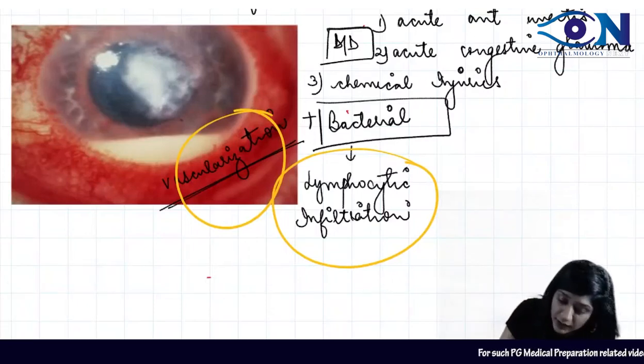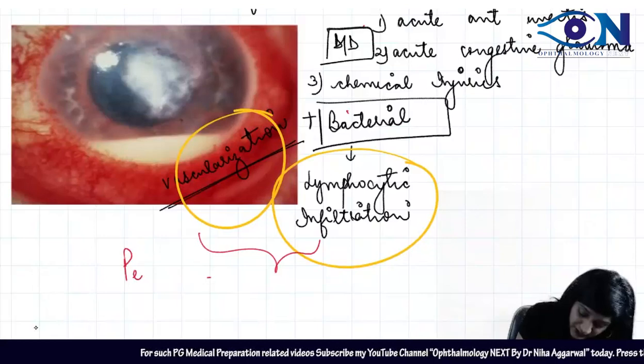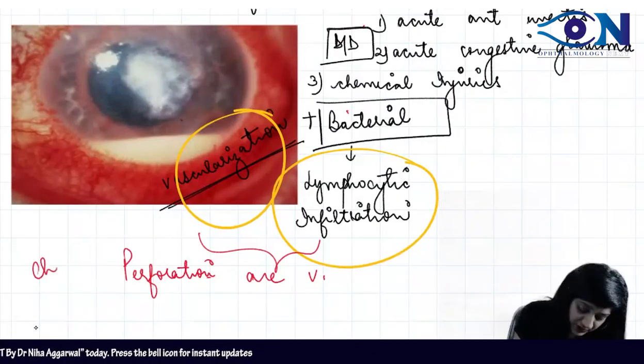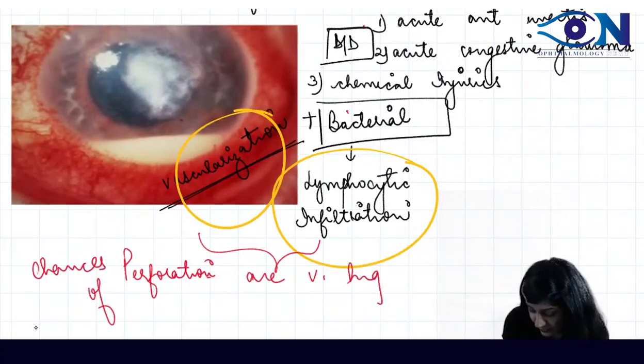Yes or no? Now because it can go deeper and deeper, therefore the chances of perforation are very, very high.